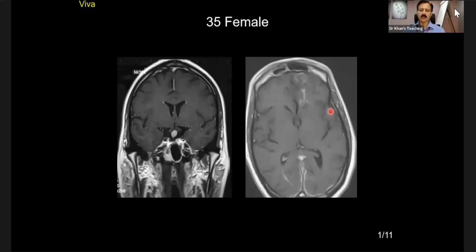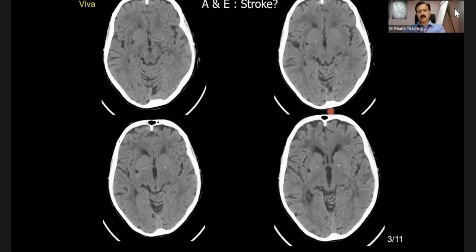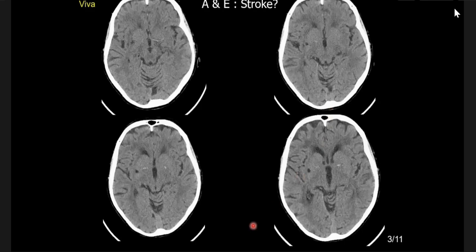Okay, different case. You are reporting this as on-call radiologist, and is there any stroke, particularly on the right side? Okay, so I can see bilateral frontal subcortical or deep white matter hypodensity. Yeah, that is age-related. I'm not interested. Any? Okay, I can see, other than the obvious lacunar infarct, what might appear to be a left MCA hyperdense MCA sign.